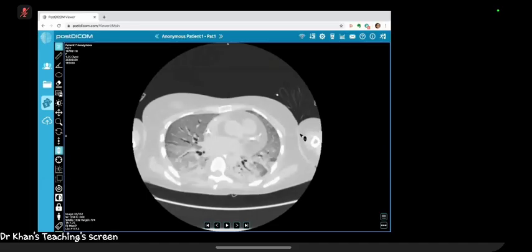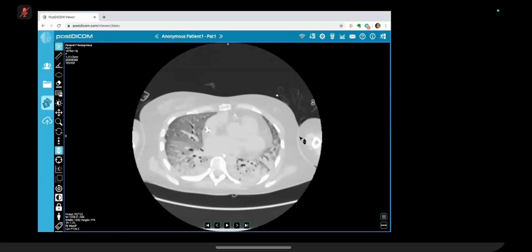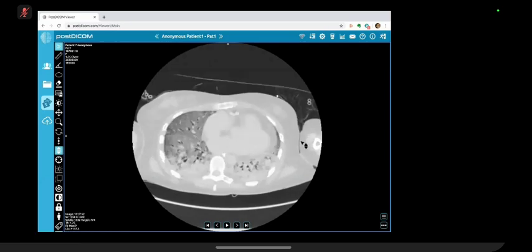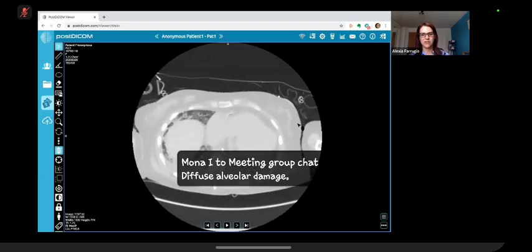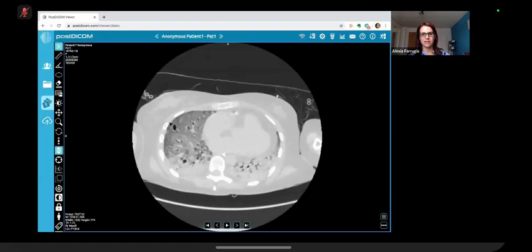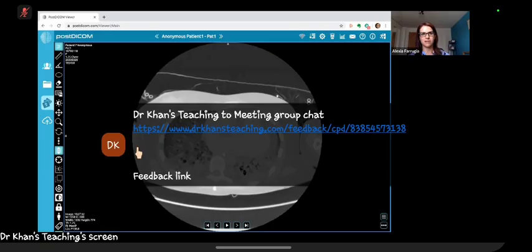There are air bronchograms throughout both lungs. Again, with the pattern, PCP will be up in my differentials. This picture can also be presented as an ARDS, with the patient intubated and acutely septic, with a gradient and consolidation in the bases. That's great. So there is a gradient in this region, with ground glass and consolidations in the more dependent areas.